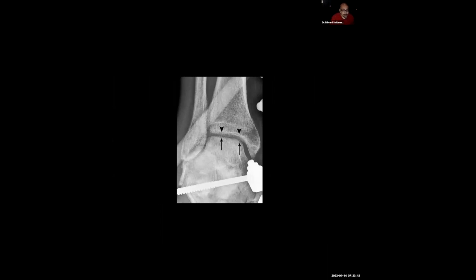As you can see here, patients are reduced with external fixation, pins, what have you, in anticipation of final osteosynthesis and fixation. We follow our patients here to assess not only the stability and congruency of the fracture reduction, but also to monitor for osteonecrosis. Bones with intact blood supply are typically going to demonstrate disuse osteopenia, and that's reflective of intact vessels. So there's hyperemia and healing going on. So what is bone going to try to do? It's going to resorb and then try to repair later.